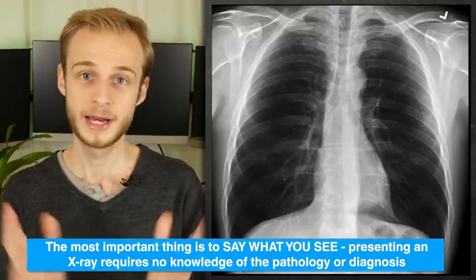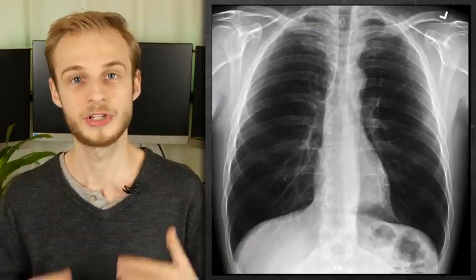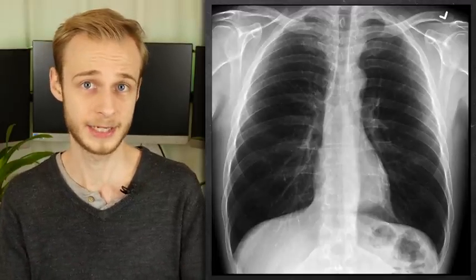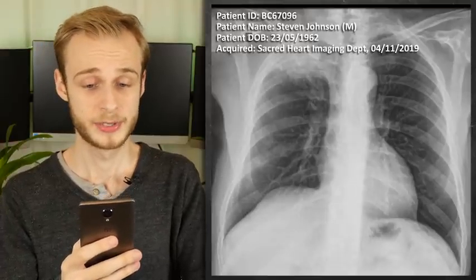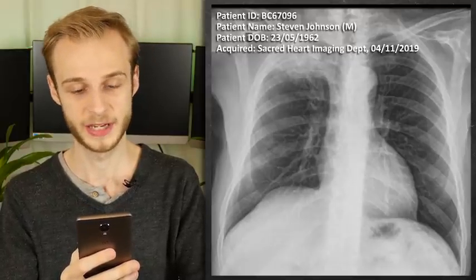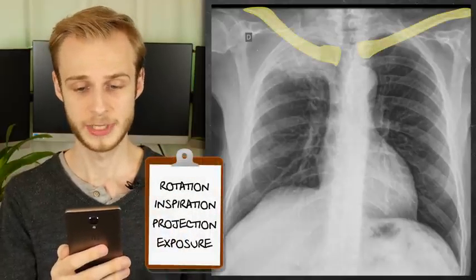So now that we understand everything that we're looking for, here's one I prepared earlier, which I'm going to present to you in a way that would be acceptable on most ward rounds or in an MDT meeting. So I've got the image for you here. This is the x-ray of Stephen Johnson, a 57-year-old male. It was taken on the 4th of November 2019. There are no previous x-rays available for Stephen. So just looking at the quality of the image, there is minimal rotation.